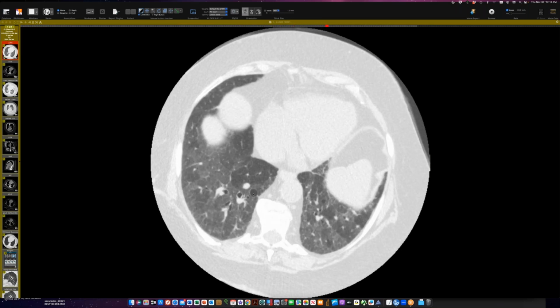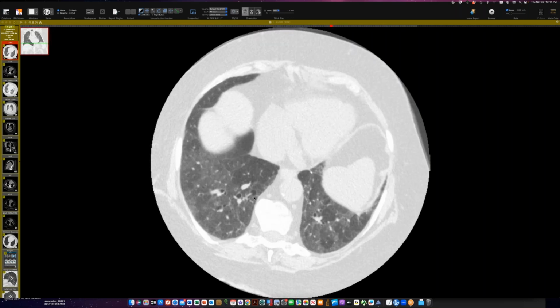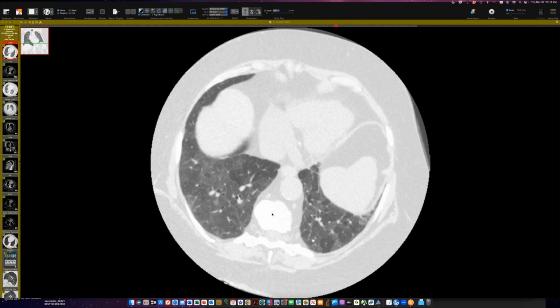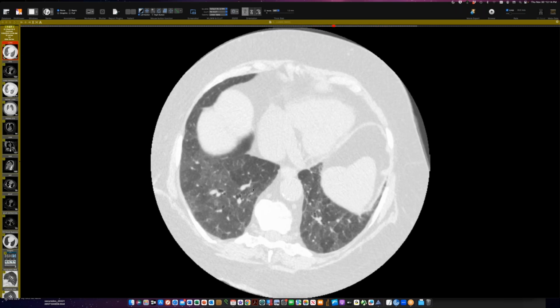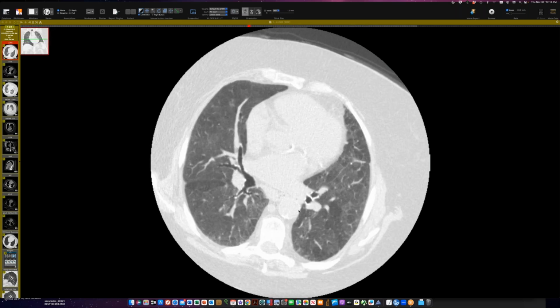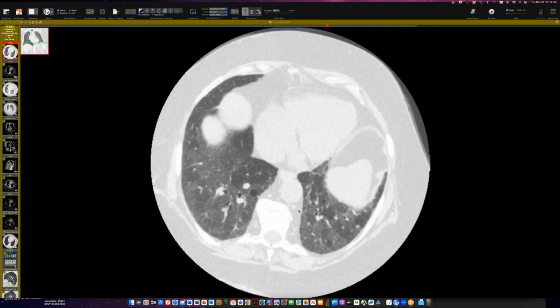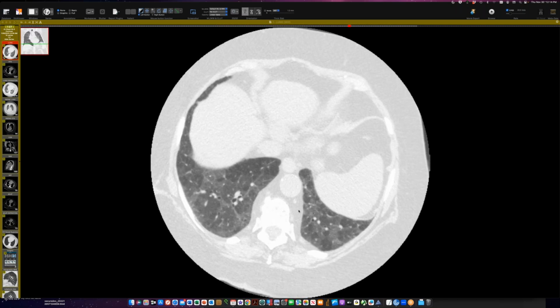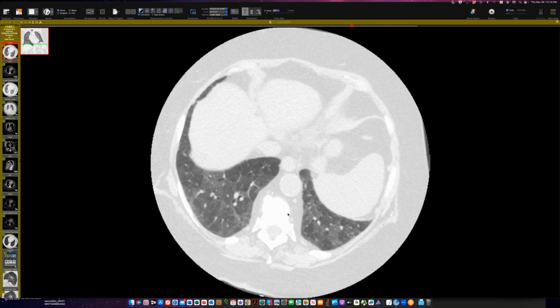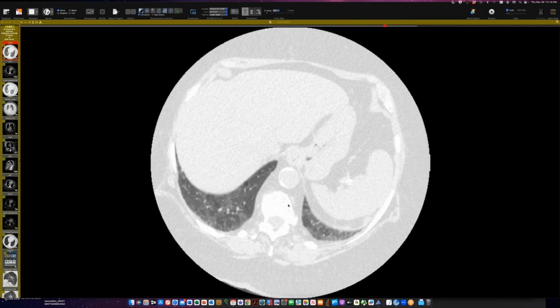So here are a few thin wall cysts like this, which goes with Sjogren's, probably some light chain deposition that's leading to some macrophage activity that ends up excavating the lung like that. But in the setting of hypersensitivity pneumonitis, you can also see cysts like this. So I encountered this pattern. I think this looks like HP to me, chronic hypersensitivity pneumonitis with some mosaic attenuation, and there were expiratory views that did show that there was air trapping, that this lucency is really air trapping. And cysts can occur with that, but this is Sjogren's.